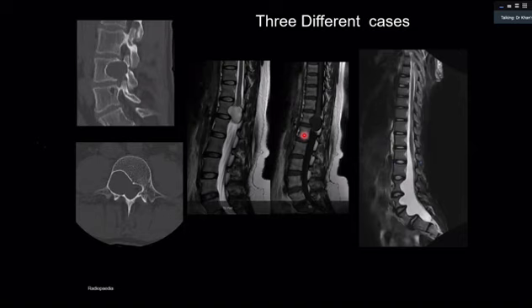You cannot make a diagnosis because an intradural extramedullary lesion might be sitting here, and this is, by the way, not intramedullary, it is intradural extramedullary. It is pushing the cord and giving you this pseudo appearance. So that is the learning point in this case, that you have to ask for axial in the beginning. I would like to see the axial, describe it, and then tell the examiner that I want to make sure that it is where it is.